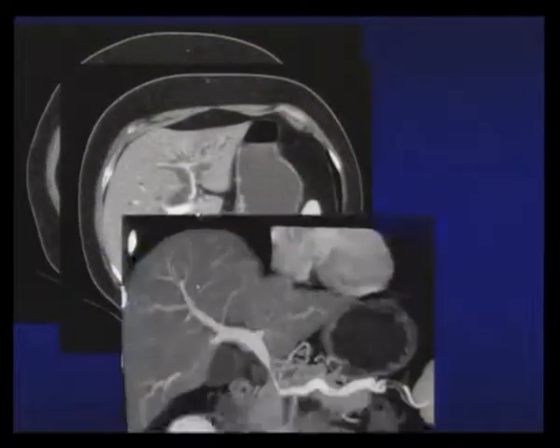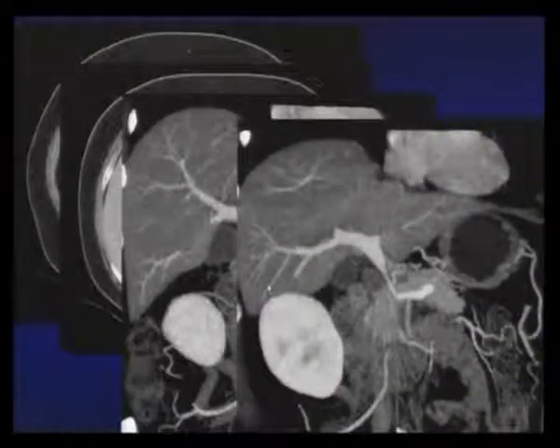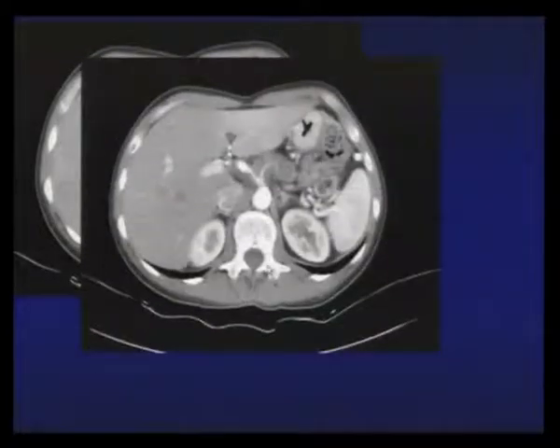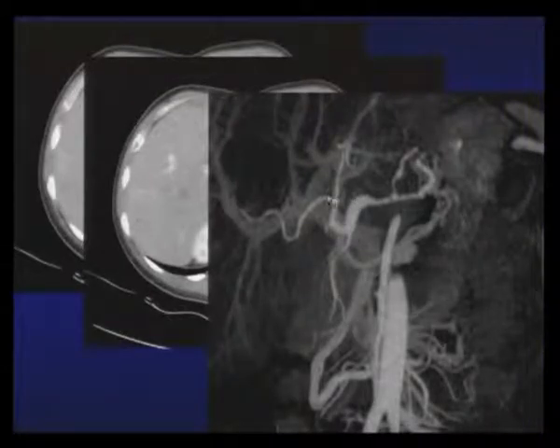And here again, this is a constriction of the portal vein from cancer, and on the contrary it has completely cancelled the signal of the superior mesenteric vein, grade 4, without any doubt again. And then I want to show this pancreatic cancer. Again, multiplanar reconstruction in arterial phase, and here we see the complete involvement of the celiac trunk.